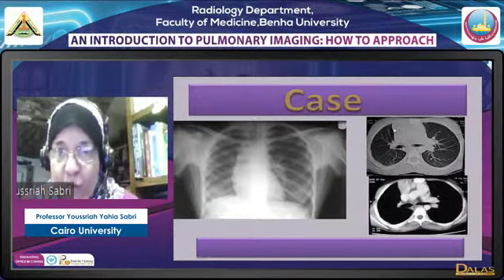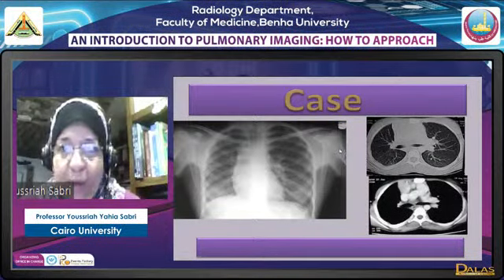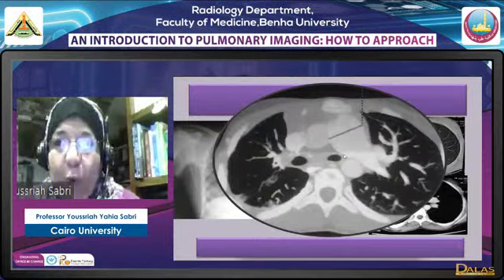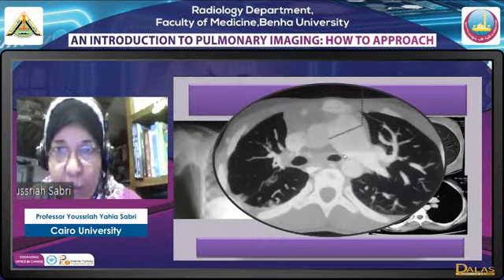Why? What has caused this small lung? There is no lobectomy, there is no lobe removal, there is no lobar collapse. What is the cause here? It is actually a congenital hypoplastic lung. It's a small black lung, born as such.